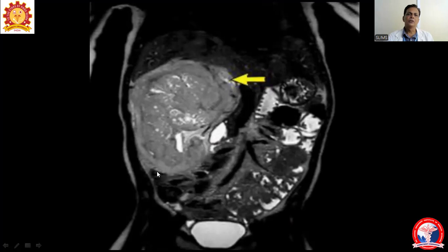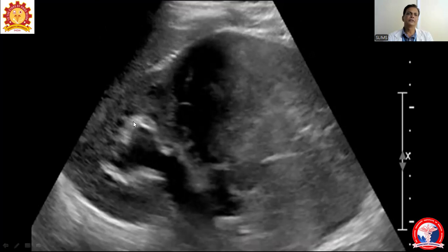Renal cell carcinomas are prone to cause renal vein thrombosis, which can extend to the IVC. According to its extension, the treatment is planned, and so there is grading. And here we are seeing an ultrasound image. We are trying to see pathologies in different modalities. We saw a CT scan of a renal cell carcinoma patient, then we saw an MRI image. Now here we are seeing a sonography image.